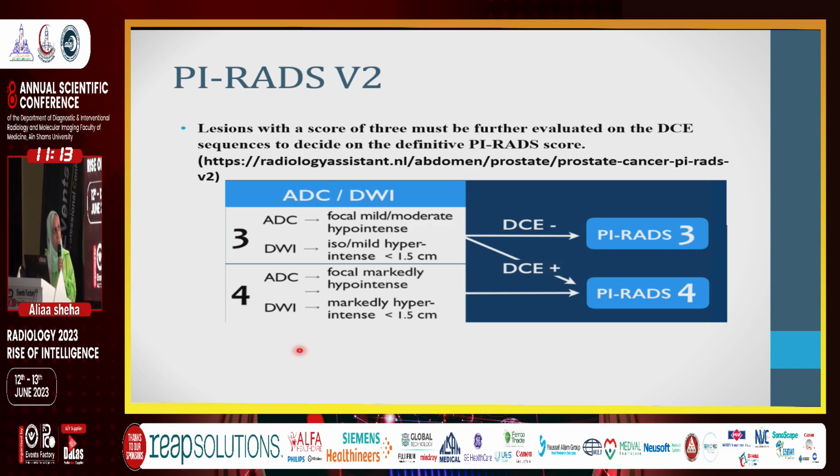Then here comes the role of the dynamic contrast enhanced images. When we have a PIRADS 3 lesion, we look at the dynamic images. If it is negative for early focal enhancement, it remains PIRADS 3. If it's positive, the lesion is upgraded to PIRADS 4.